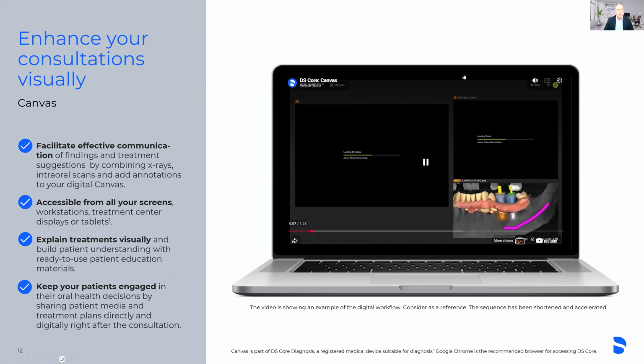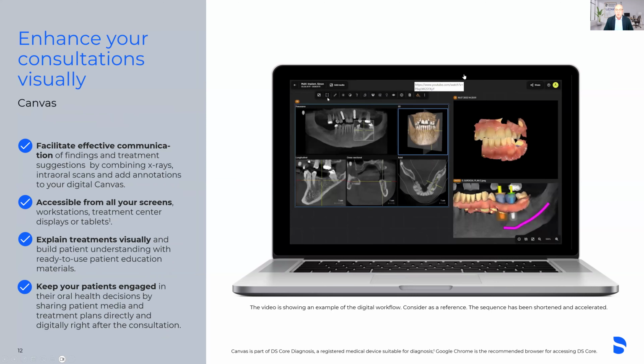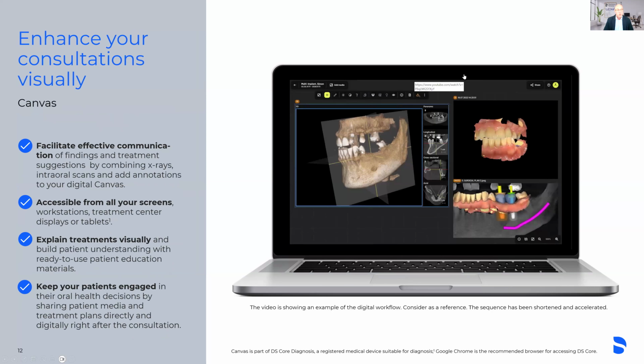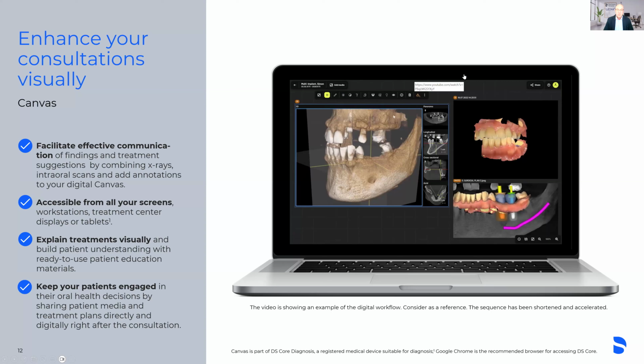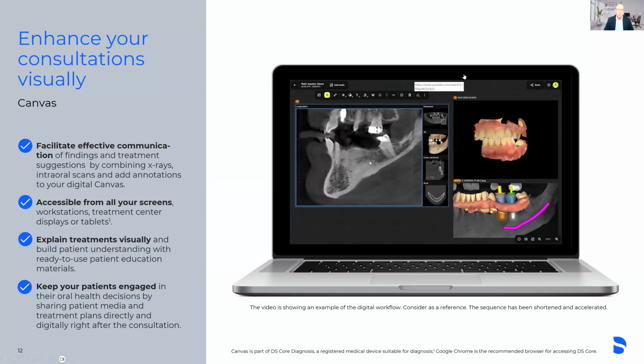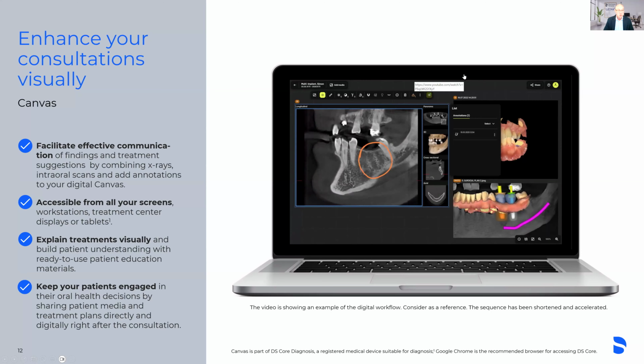So we have Patient Canvas built into DS Core where you can bring in your CBCTs, you can bring in your scans, you can bring in your x-rays, your panos, and you can annotate on them. You can add education pictures on them. And this is what's great here, is you can actually keep your patients engaged and share directly out of this canvas. So you can share just with the patient's email so that way they can see exactly the treatment that is planned and review that treatment with their family and loved ones before they commit to the treatment.